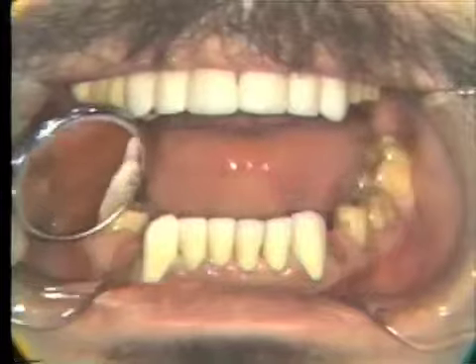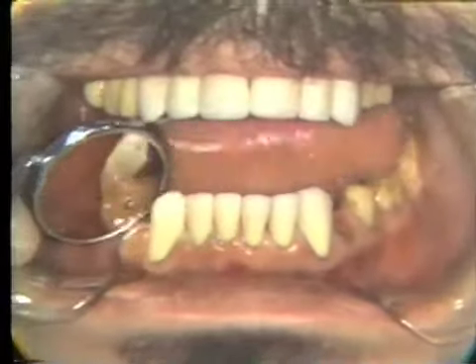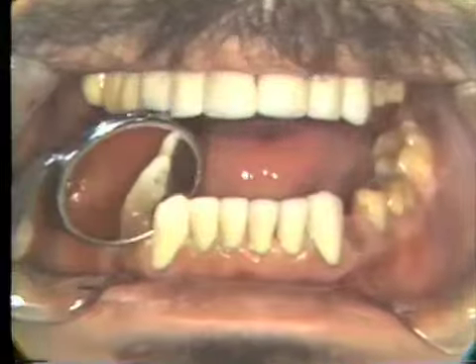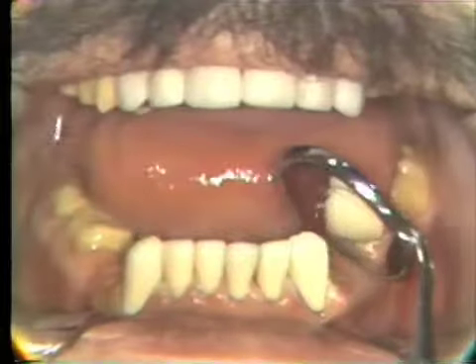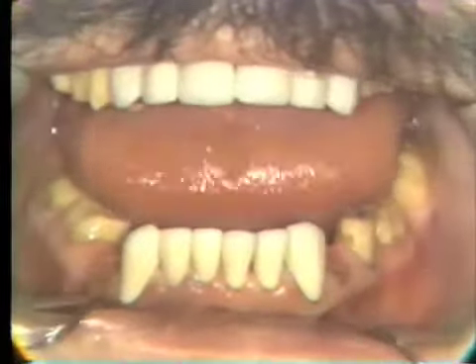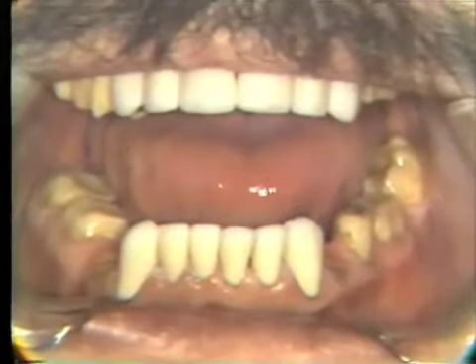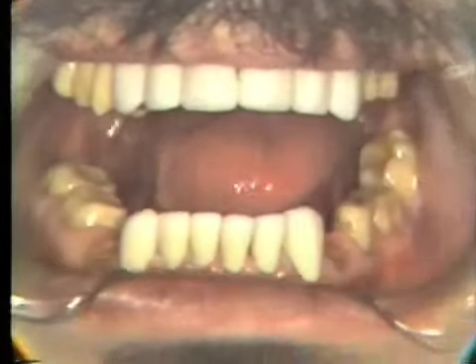Now the one contact that we have is on the distal of the canine. We want to remove that. You can see the contact that we have on this canine. Lighten the contacts to pick up a little more contact on the anterior teeth. Now we want positive contact on the canines and just barely a light contact on the centrals and laterals. Let's have a small stone.